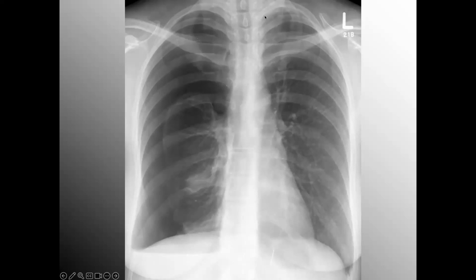I don't see anything else for bones. My spine looks normal alignment. C, cardiac. I don't really see a clearly delineated right anterior border. I do on the left side, so there's something maybe on the right.